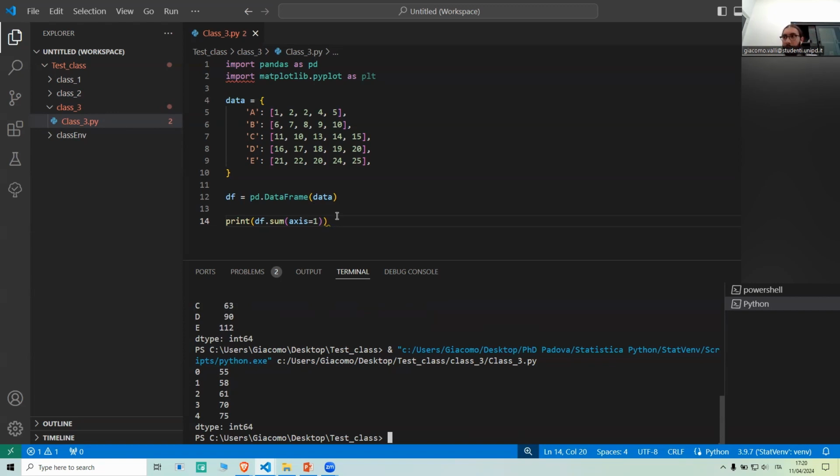You can do the opposite, but you will be penalized in terms of performance and also in terms of correct functioning of the functions, because some errors that the data frame is automatically catching, some kind of conversions and so on, may be better optimized if you are performing operations over columns. So by default, you should consider the data frame as something that is supposed to work over columns.